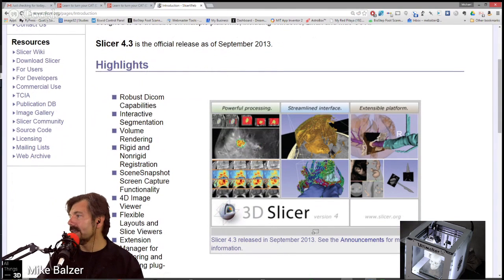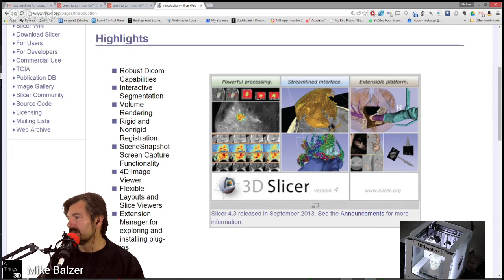It identifies right here some of the highlights of it, and we're going to only explore probably just a few of them. It's got a ton of stuff in there. And that's probably the first thing, is kind of wading through, as I call it, the Swiss Army knife of 3D visualization. Like a lot of open source, you've got a lot of excited people making things for it, and it just kind of, in my case, bloats it. And so you have to wade through some of the features you don't know and get right to the ones that you do need.